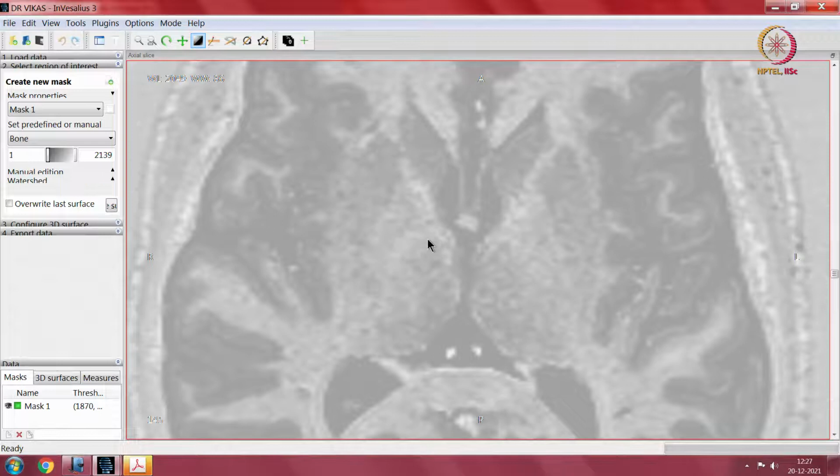So, you can find some structure here, darkish. This is white matter, this is grey matter. That is the differentiation. So, white and grey, this is the thalamus in here, thalamus in here. This bulge which is coming into the ventricle is the caudate head.